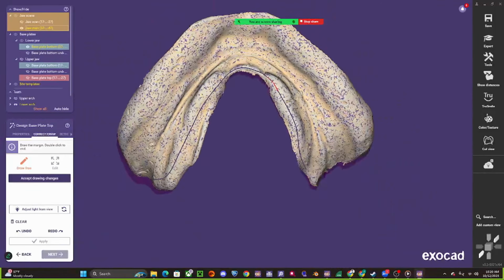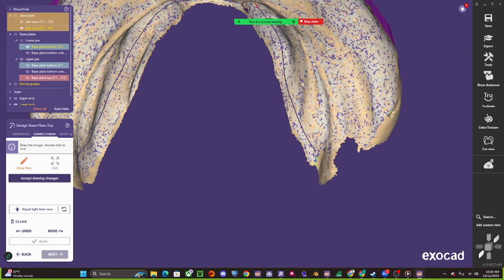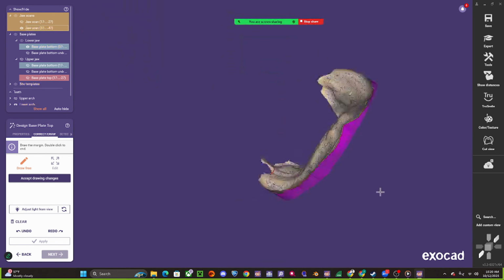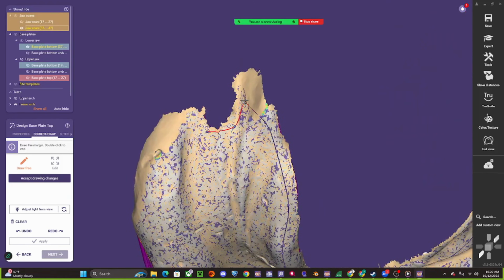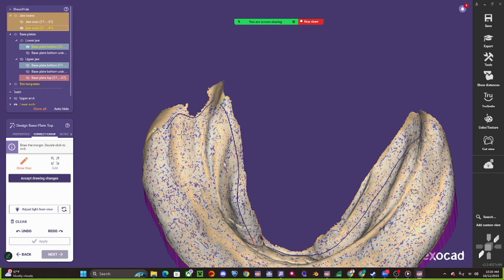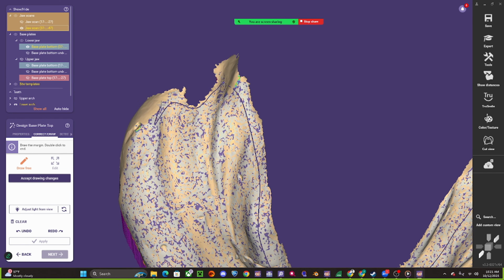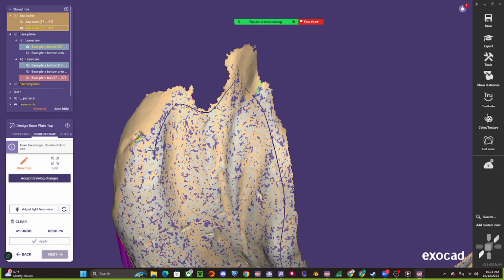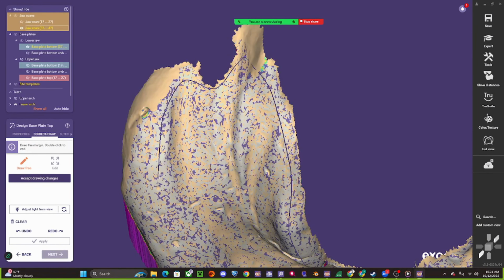It's all about the visuals so you can see how it looks and all this anatomy. So back here, this got cut off. I'm sure we can add material to the denture base, like light curable, right? And just build that back up is something I would do if I saw something like that. You can add a light curable putty, even pink, whatever color, or any composite that you can mold in that back, and just fill that in just so you get that retromolar pad a little bit more.